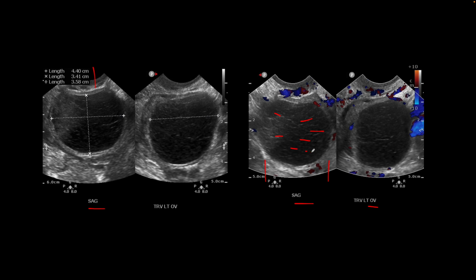These happen frequently, that there is hemorrhage in a follicle inside the ovary, and it causes acute abdominal pain. Patients seek attention, and an ultrasound can show something like this. They can also get a CT where a cystic lesion with a hematocrit sign may be seen, and we recommend a follow-up in 6 to 12 weeks when these lesions usually resolve.